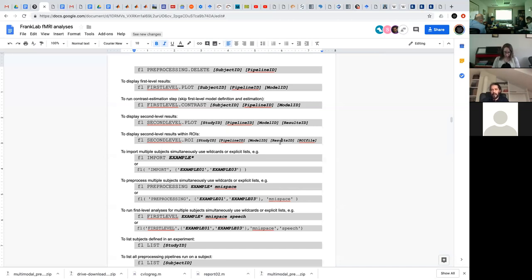It's not going to change much, because SPM is likely not finding any temporal correlation if your sparse acquisition was long enough to remove most of the cross correlation between subsequent scans, right? It's only that you are asking SPM to find that correlation when you pretty much know that there is not going to be any.